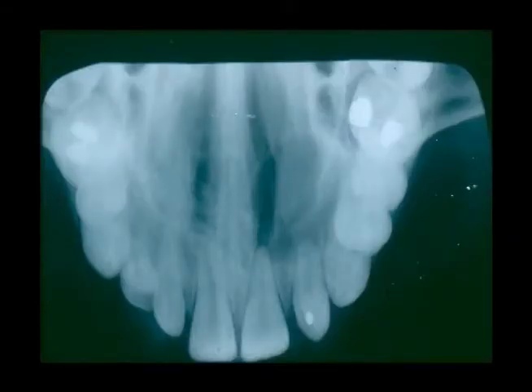Another case we can see on a standard maxillary occlusal radiograph is a radiolucency on the patient's left side, and this radiolucency is well corticated. This would be considered to be a radicular cyst. Although I should point out that from a radiographic point of view, in many cases it is very difficult to differentiate between a radicular cyst and a granuloma until the pathology has been examined microscopically. The hydraulic nature and the cortication in this particular case would be indicative of a radicular cyst.